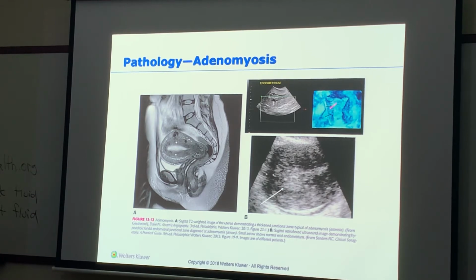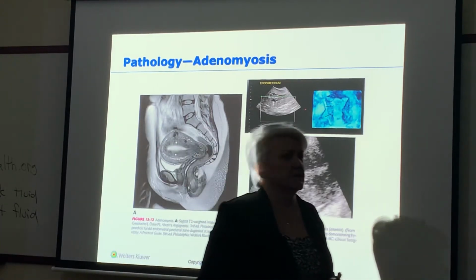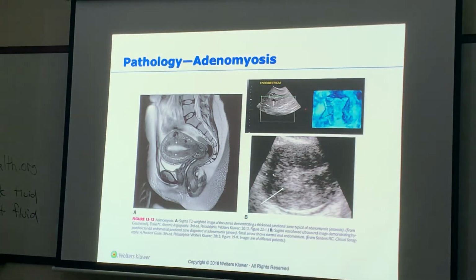What is this view right here? It is coronal, but how did I get it with ultrasound? 3D. 3D. It's a 3D image with ultrasound. Now y'all are gonna learn 3D. I never learned 3D. That came after I already came to the school. I have a complex endometrium.